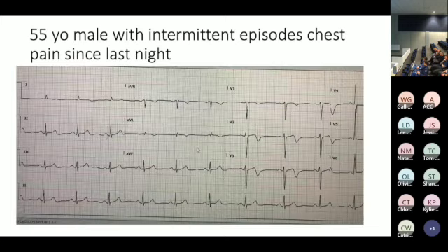Okay, a few more to go. So what's this? Spot diagnosis patient. Yeah. So are we activating the cath lab for this guy? Yes. Pain now. Yeah, excellent question. He's pain-free now. Good. So, yeah, I'll go into it in a second.